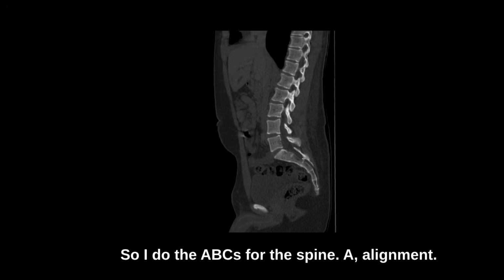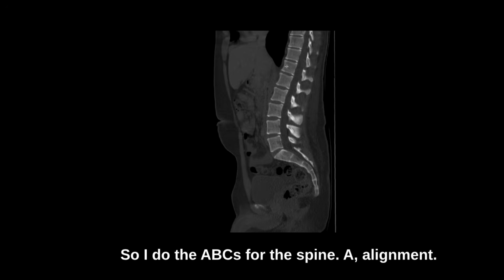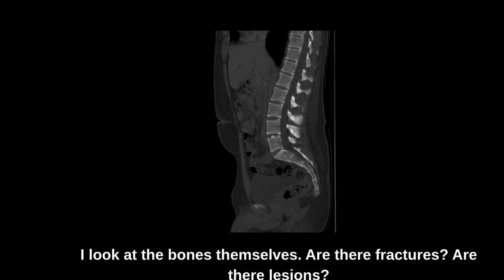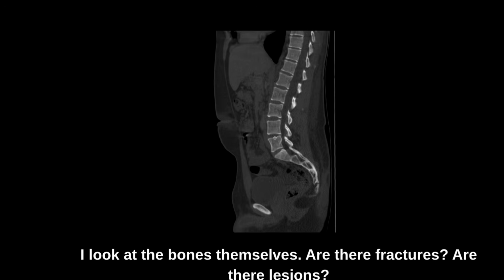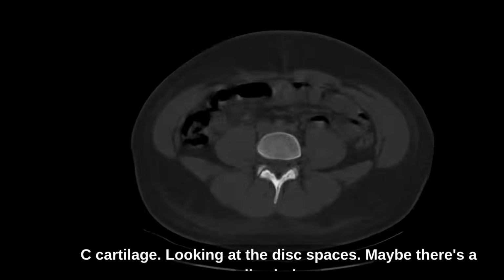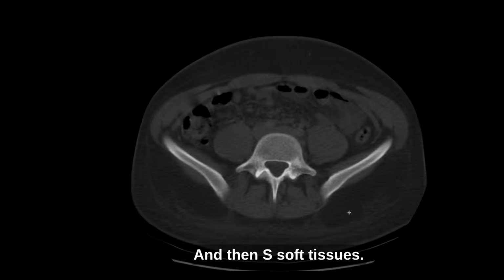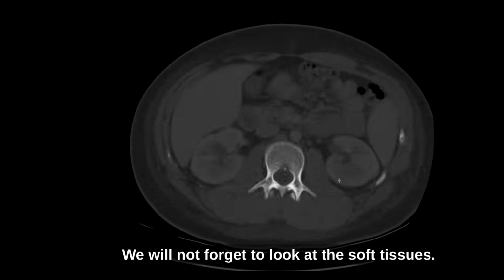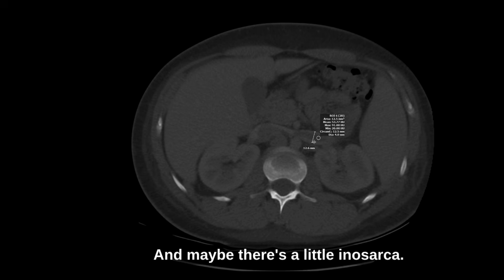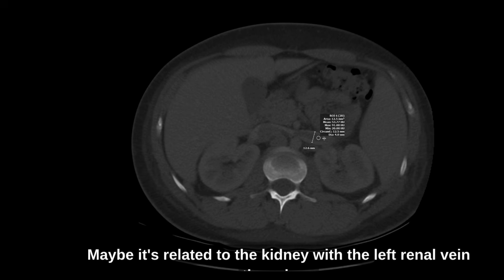So I do the ABCs for the spine. A, alignment, looks pretty good. So anterior, posterior, spinolaminar lines. I look at the bones themselves. Are there fractures? Are there lesions? C, cartilage, looking at the disc spaces. Maybe there's a disc bulge. And then S, soft tissues. We will not forget to look at the soft tissues. And hey, maybe there's a little anasarca. Maybe it's related to the kidney with the left renal vein thrombus.